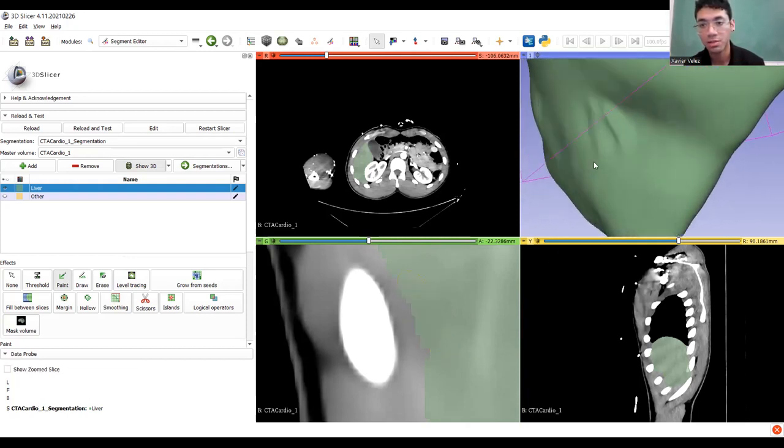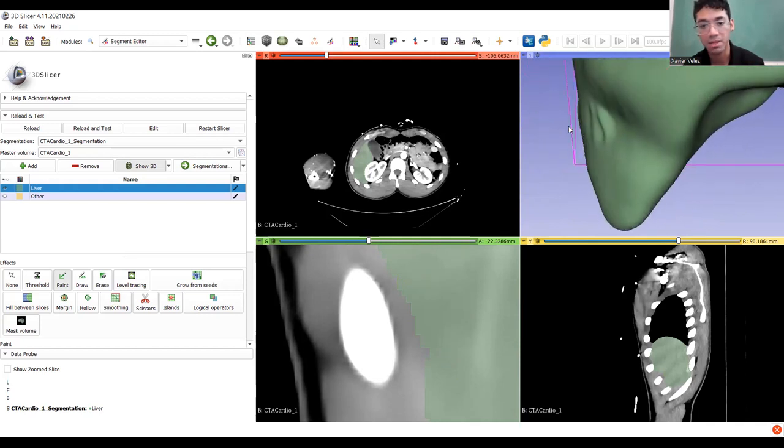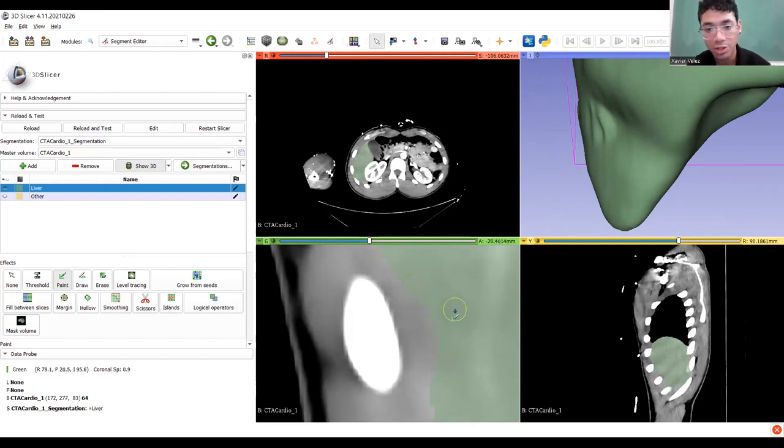So yeah, this looks pretty weird. If I'm being honest, I'm thinking maybe this gap is supposed to be there or something. I don't know. I'm just going to complete it because why not? But really, maybe save this step for some glaring things that might look a little weird. And again, I've got to be honest, I've been skipping this step pretty frequently. When I do this, I've just been trusting Slicer to do me right when it comes to the anatomy.